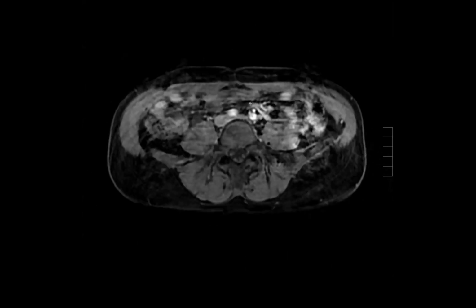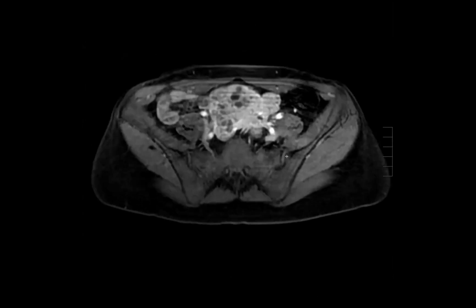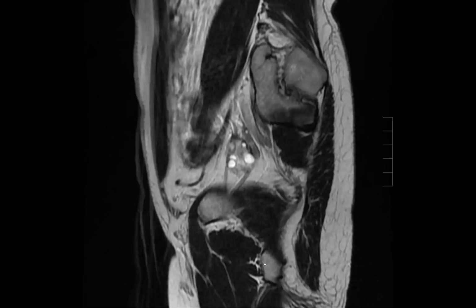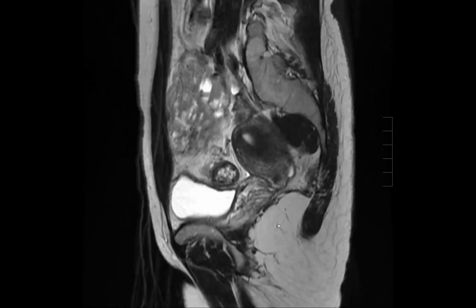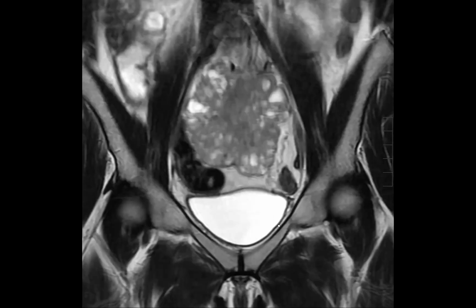Okay, but there are some small bowel loops that seem to be connected, coming off the left side of the mass. Patient left. I guess just to cut to the chase, you always think about GIST when you see big masses. Although this looks weird for a GIST, as GISTs are usually centrally necrotic, not with these cystic spaces peripherally.